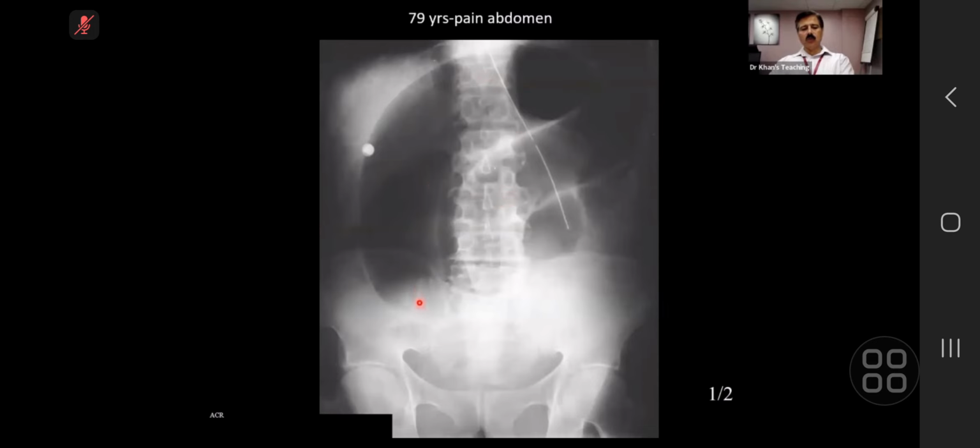Ahaustral margin. So this is the limb which is going superiorly, and this is the limb which is coming inferiorly. In between these two limbs is this white line, which is because of the opposing walls. And there are signs in old radiology literature: inverted U sign, ahaustral margin, the apex under the left hemidiaphragm, apex superior to the level of T10, things like that.